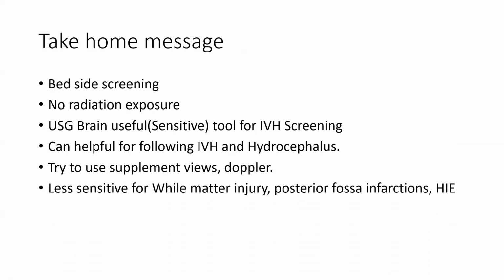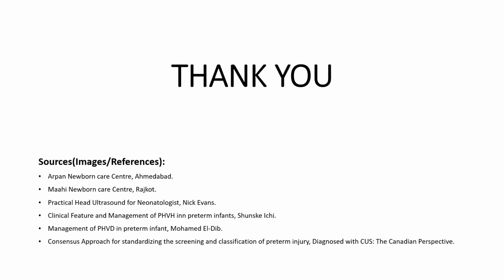Please try to use supplementary views, basically the mastoid view specifically to rule out cerebellar hemorrhage, or if you want to do the MCA RI, then definitely you need to use the temporal view. Again, it is less sensitive for white matter injury, posterior fossa infarction, and HIE. Thank you.